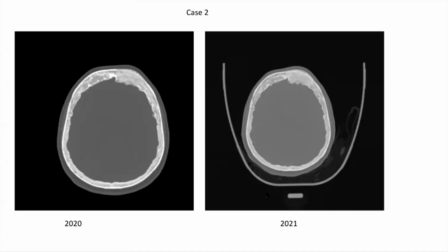Here's our next poll. Do you think this is fibrous dysplasia, metastatic disease, lymphoma, intraosseous meningioma, intradiploic epidermoid, or an osteogenic sarcoma? So we have a couple takers for fibrous dysplasia. It seems like that is the going thought.